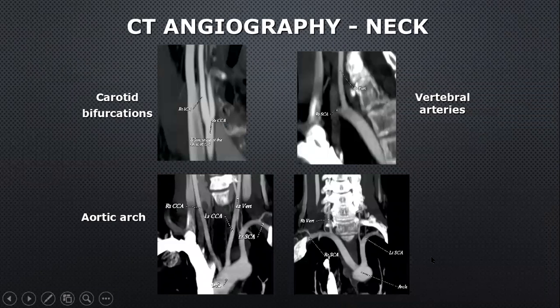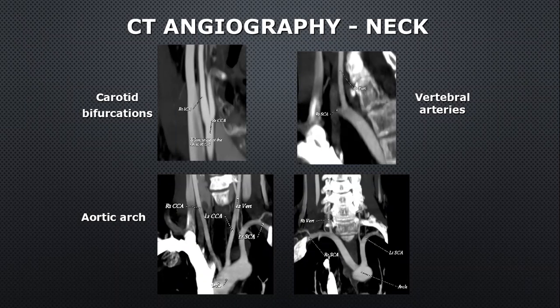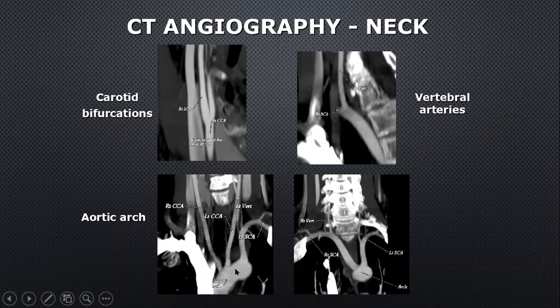I haven't really discussed various imaging modalities, and the reason is because we can use each one of them depending upon the availability, of course, but also what you're trying to understand. And this is just a CTA angiogram, just to show you that CTA can show you the arch anatomy very well, can show you the origin of the vessels coming from the arch, if there is calcification, and also if there is a stenosis.